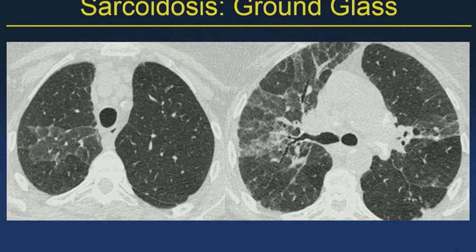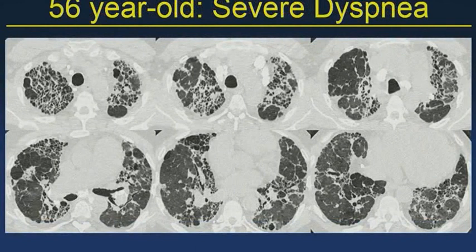It's a patient with more advanced sarcoidosis. This is fibrotic sarcoid. You can see these irregular linear opacities, parabronchovascular in distribution. We'll talk a little bit more about fibrotic sarcoid here in just a second. But notice the ground glass attenuation opacities here, which if I was to cut this lung in cross-section, we would see is likely due to microscopic fibrosis. So ground glass can be seen in patients with sarcoid, but it's rarely the only finding, actually quite rare for that to occur.